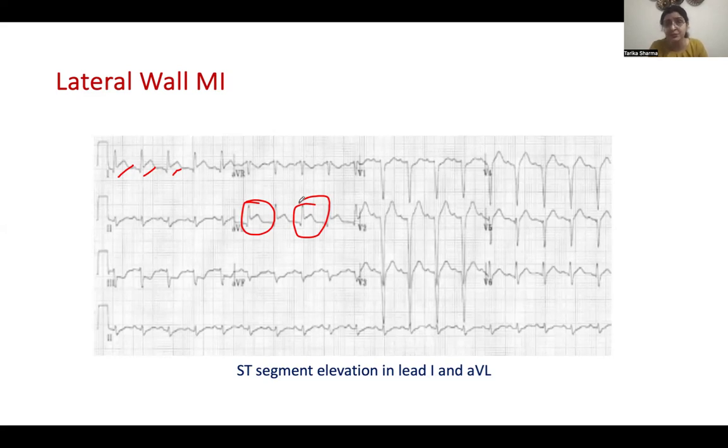That's something different, but for your understanding, you have to just memorize that. A person might be having ST segment elevation, where the person might be having anterior wall, lateral wall, or inferior wall myocardial infarction. And when you observe the ECG, you have to observe the leads which are supplying that portion of the heart, and depending on that you can clinically classify the myocardial infarction.